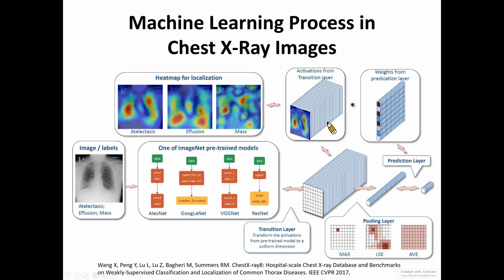Then not only can you browse these chest X-ray images, but the model will also return a diagnosis from these images and try to give a tentative assessment of whether there's pneumonia, whether there's a presence of lung fibrosis, whether there's pleural effusion, and what about the heart size.